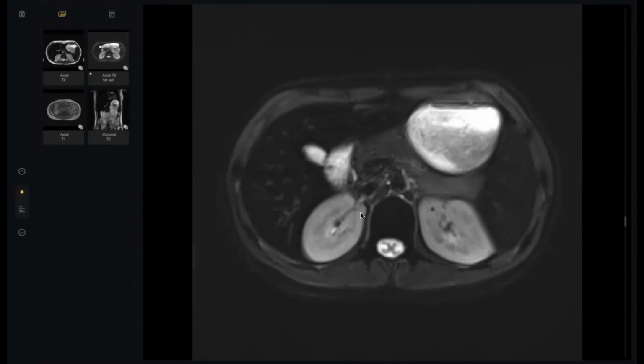There is a specific MRI examination in my center called iron load measurement. We only do T2 star, and automatically, by some mathematics, the machine gives us the expected iron overload in this liver. Okay, by T2 star. Why? Due to the susceptibility artifact of the iron.